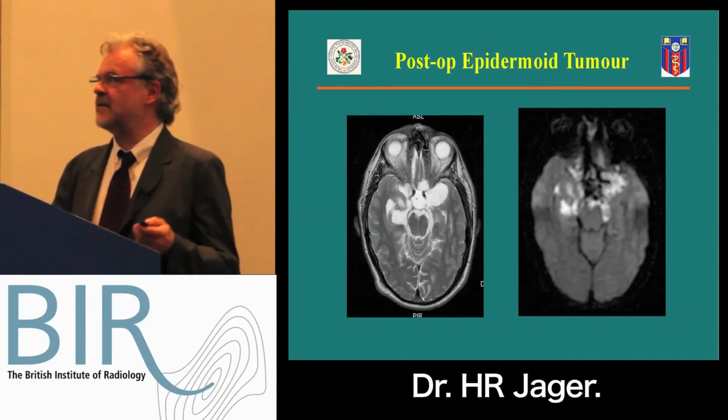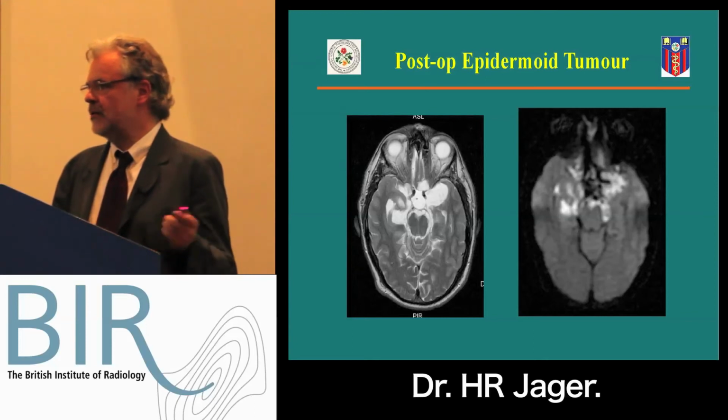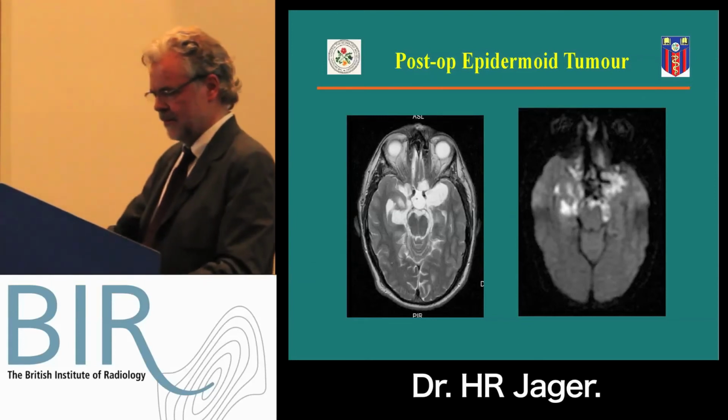These tumors don't enhance. They may show variable signal on FLAIR. You have this lobulated cystic thing. It's a mess on the T2. You don't know what's going on. You do the diffusion weighted imaging. You see, okay, they removed it, and there it infiltrates still around.